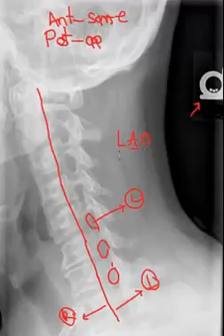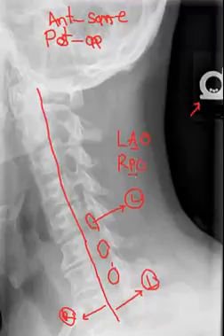If, in fact, a posterior oblique was taken, a right posterior oblique would result in visualization of left side IVFs also. Therefore, for this particular radiograph, this patient was positioned in either a left anterior oblique position or a right posterior oblique position. This is the most that we can deduce simply from visualizing the radiograph. Some clinicians use markers that specify LAO or RPO, for example, which makes it a little more useful.